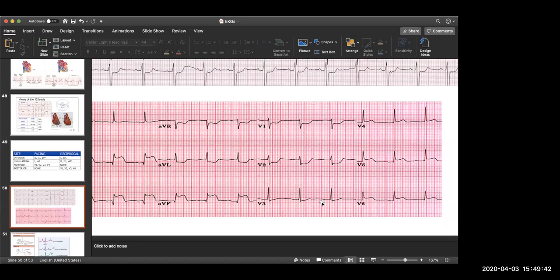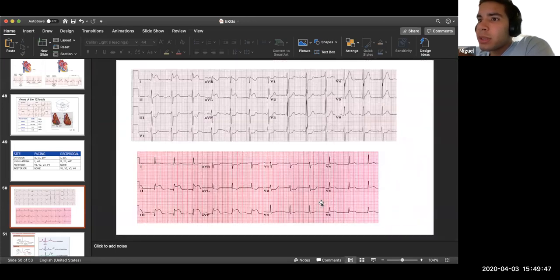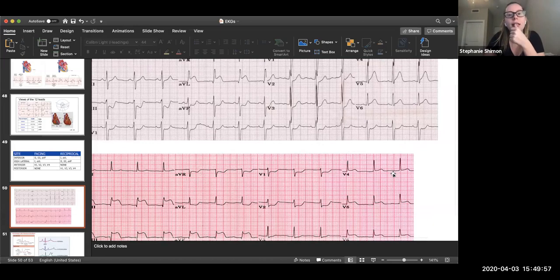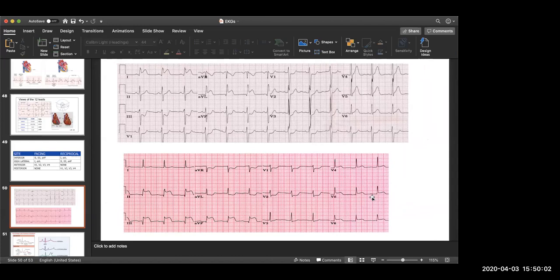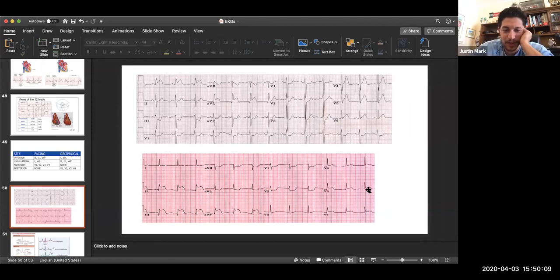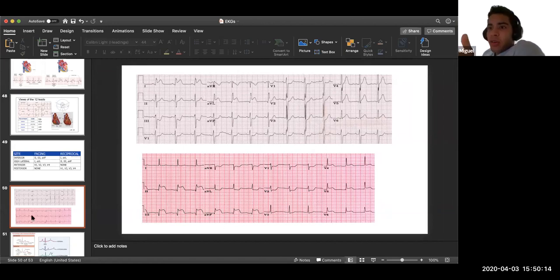AFib that led to like LA? Or it could be. But look at before, the second, almost the last before the last QRS. Super subtle, right? Kind of there. I don't know. I've never seen. Or the one below it, V5, the last QRS. If you're going looking for something that subtle, then it's probably not there. Kind of hard to tell. We're not experts, so who knows? But more importantly, what do we have going on? Also, lastly, since the rate is almost 75, that's the rate of the SA node as well.